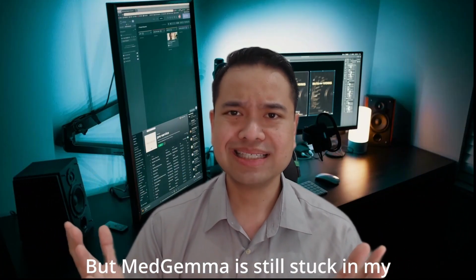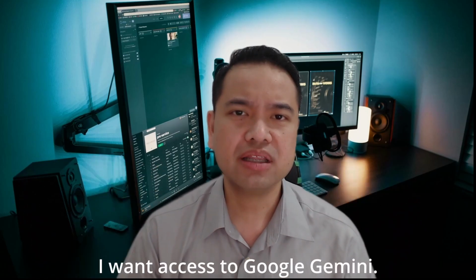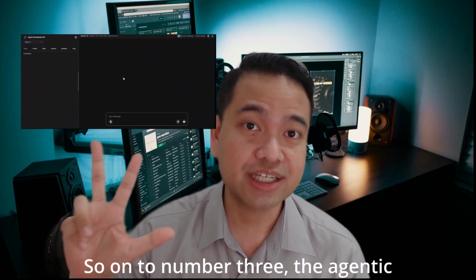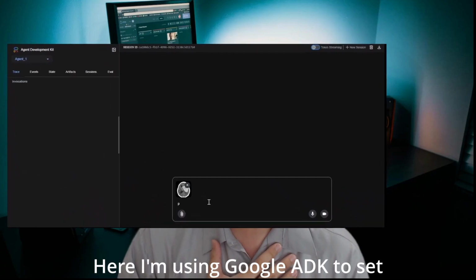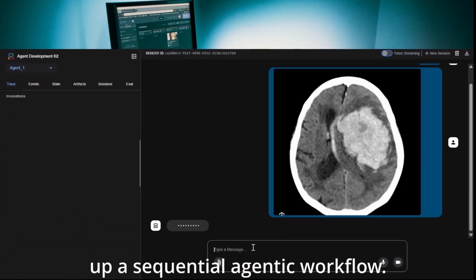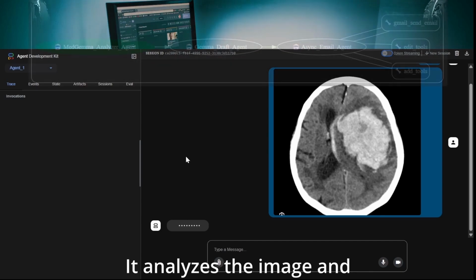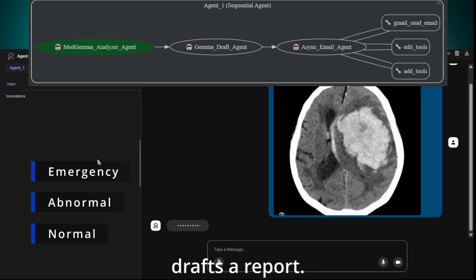But MedGemma is still stuck in my computer. I want full access to the internet. I want access to Google Gemini. So on to number 3, the Agentic workflow from MedGemma to Gemini. Here I'm using Google ADK to set up a sequential Agentic workflow. I send an image to MedGemma. It analyzes the image and classifies it as either emergency, abnormal, or normal, and then drafts a report.